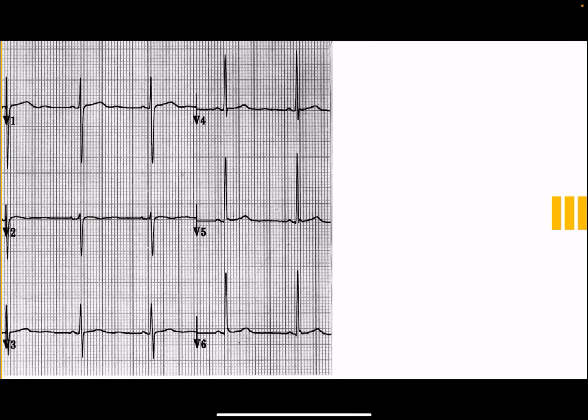So this is what happened here. This is a precordial leads ECG. This is a nice ECG actually. Precordial lead reversal. Here, V1 is reversed with V2. Unless you identify this very carefully, you cannot appreciate it. So here I will tell you the findings, how to identify this.